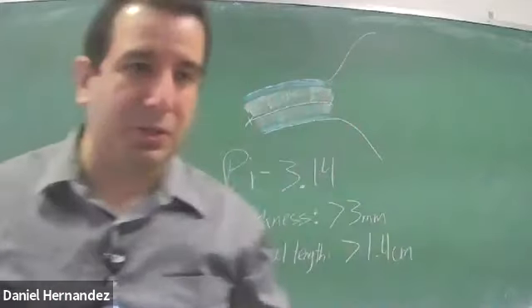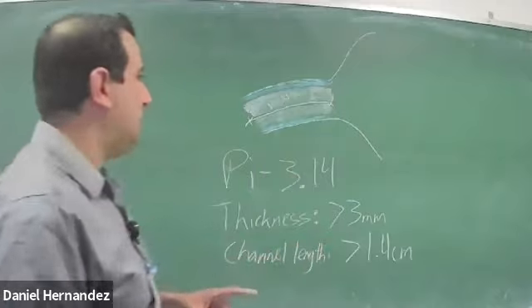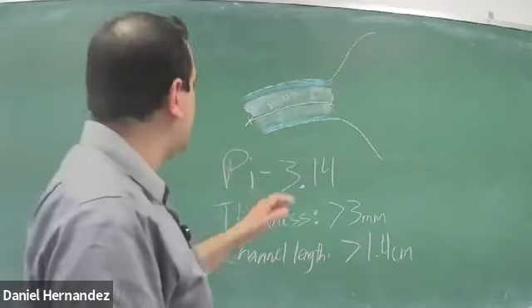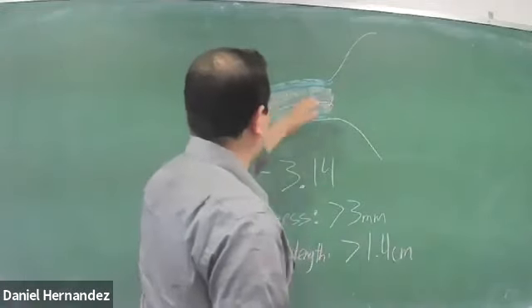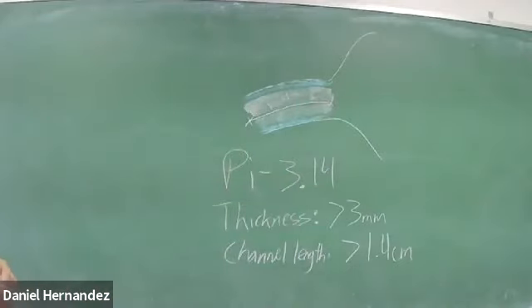So it might be beneficial to do an open trace and try and trace it. Like if you're tracing the cervical length. I don't know if you guys do an open trace when you're measuring your cervical lengths, but it's kind of similar to that. So I find it easier to just do the open trace function to get a real true channel length measurement.